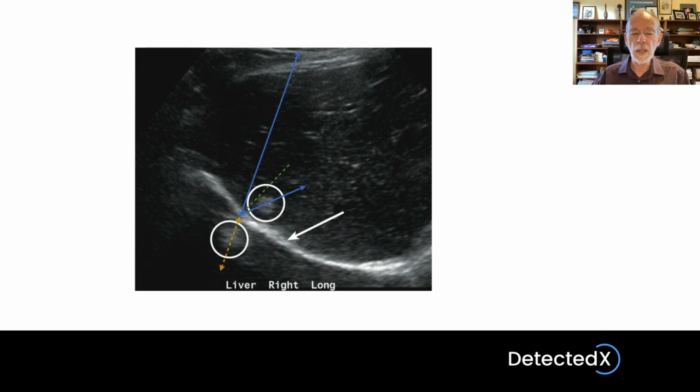Now, this is actually a special case. Normally, you don't see an object in its true location and the mirror image of that object in the same single image. It's much more common that you have to scan backwards and forwards to identify the actual source of a mirror image artifact. And the reason is shown in the next slide.